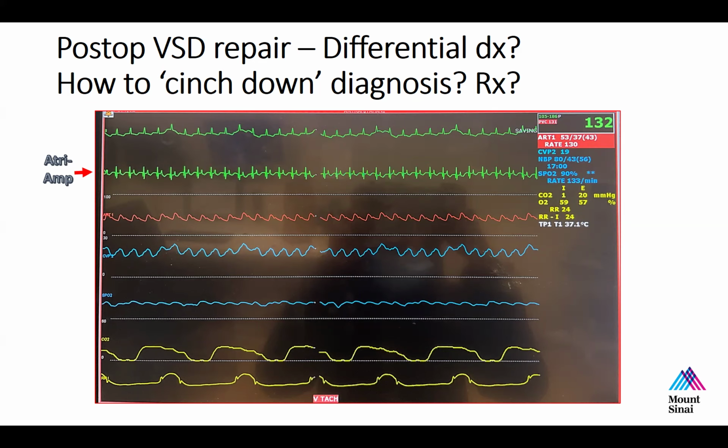So how would you know whether this QRS on this one single lead of ECG on the monitor is your usual QRS that you would see in sinus rhythm or an unusual one in VT? You're at home, it's 2 in the morning, the nurse practitioner in the ICU has sent you this tracing.